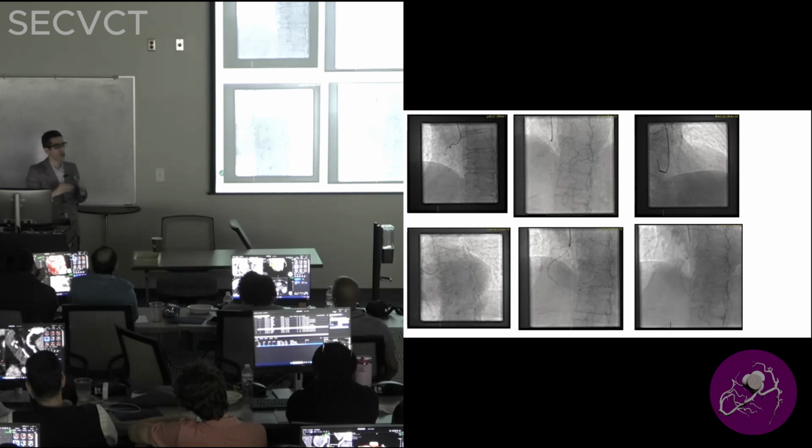Don't go too high if you're going to assess for CAD, unless you're looking for CABG grafts, which is a different story, in prospective acquisition. The second part you need to keep in mind is the distal LAD. You have to have some degree of distal or apical LAD to use it for the CT-FFR. If the LAD is not included enough, CT-FFR cannot run. They have to simulate the numbers by having that.